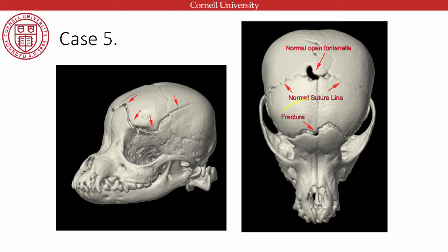This fracture here we can see running along over the frontal bone area and extending along her cranium laterally here. So we can see this. And it's wider, it's got a bit of a step, there's a little bit of displacement. So those are all things that make us lean towards this is a true fracture rather than something that is normally within the bone, a normal bone fusing, which is what's happening up here. So quite a significant fracture going on here, quite extensive from a head trauma.